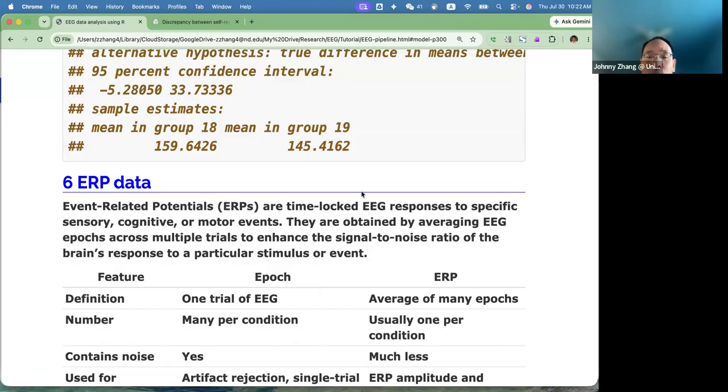For example, for each participant, they see like 250 images, right? So maybe 80 are social images they don't need to reappraise. Then another 80 maybe are social images they need to appraise. Actually, only 40. So in this case, we can average the epochs for them together, right?